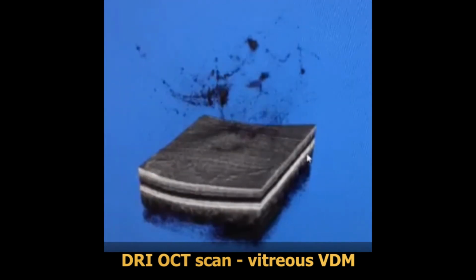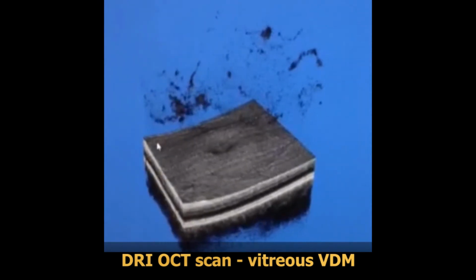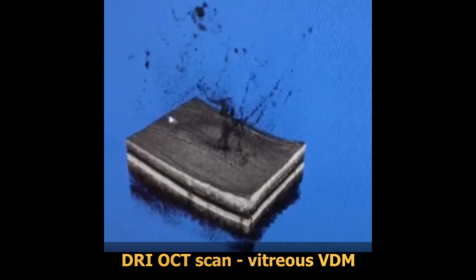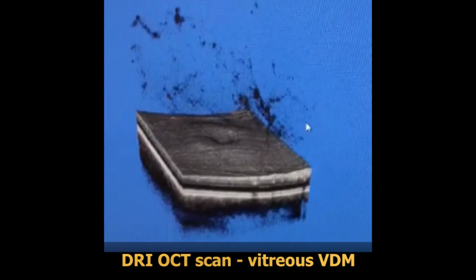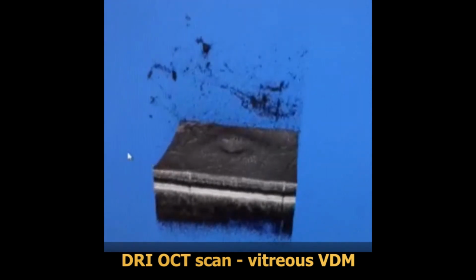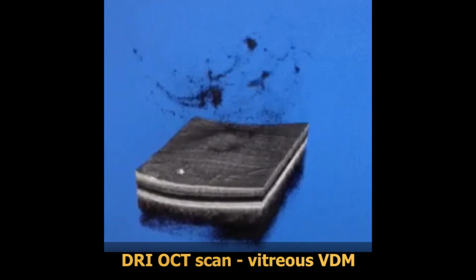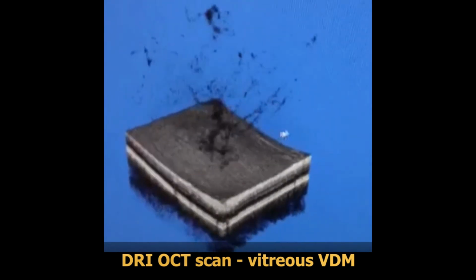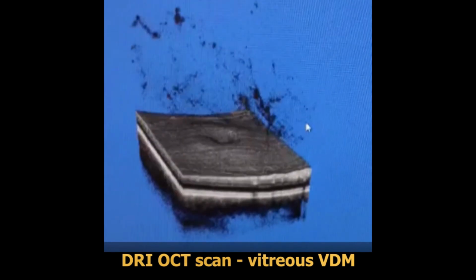The advantage of this particular imaging system over conventional imaging systems is that we can not only visualize the back portion of the vitreous, that area that's right in front of the macula, but also some of the central vitreous structure. The reason that's important is that conventional OCT imaging will not visualize many of the opacities inside the vitreous body that will create the sensation and visual phenomenon of floaters.